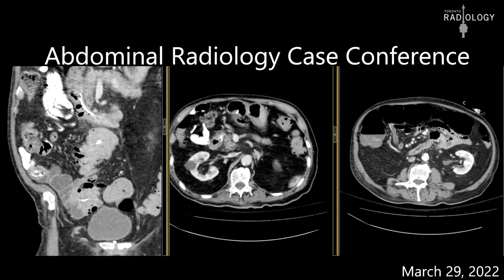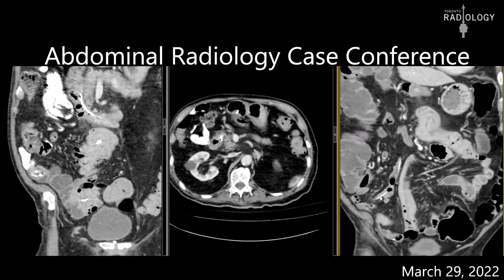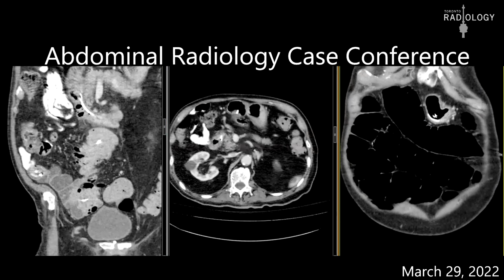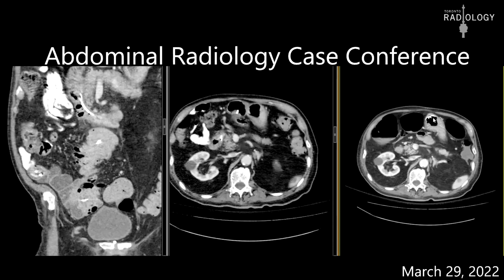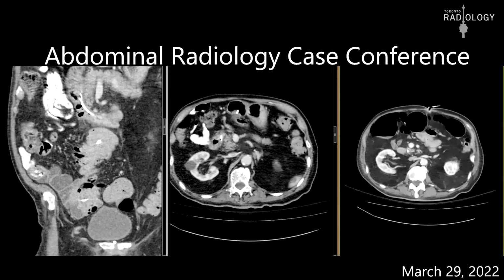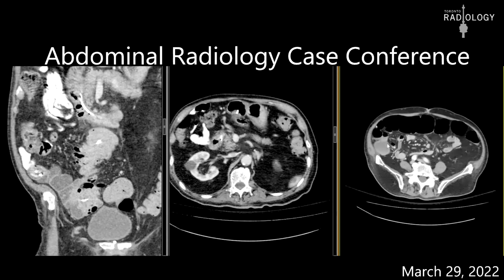And if we look at a follow-up CT, we find that the tube is just hanging. There is no telescoping, but it has been disconnected from the proximal portion of the tube. So here we find that the entry point is here, but after this bumper, it has been disconnected here. And the tube is just now lying inside the bowel. And there is no telescoping because the tension on the whole system has been released.